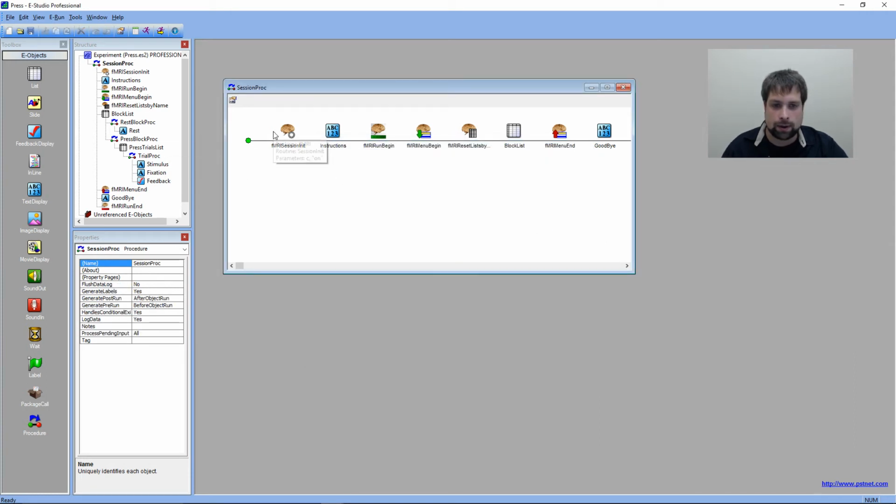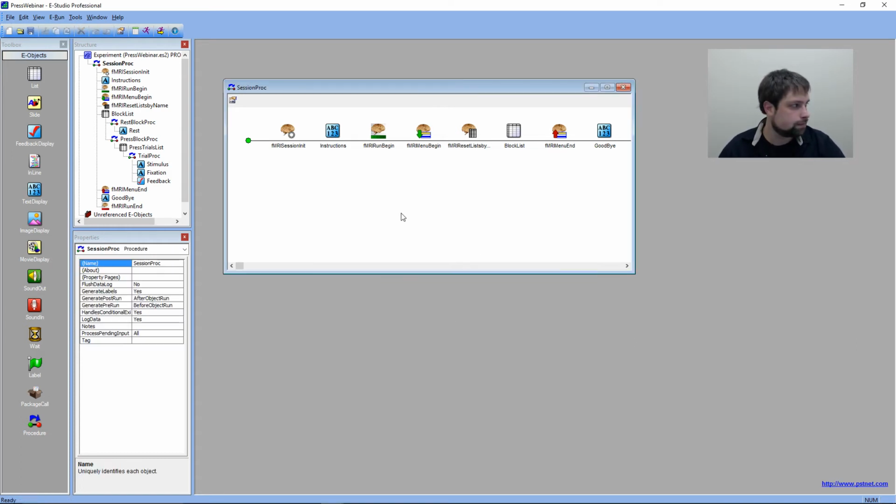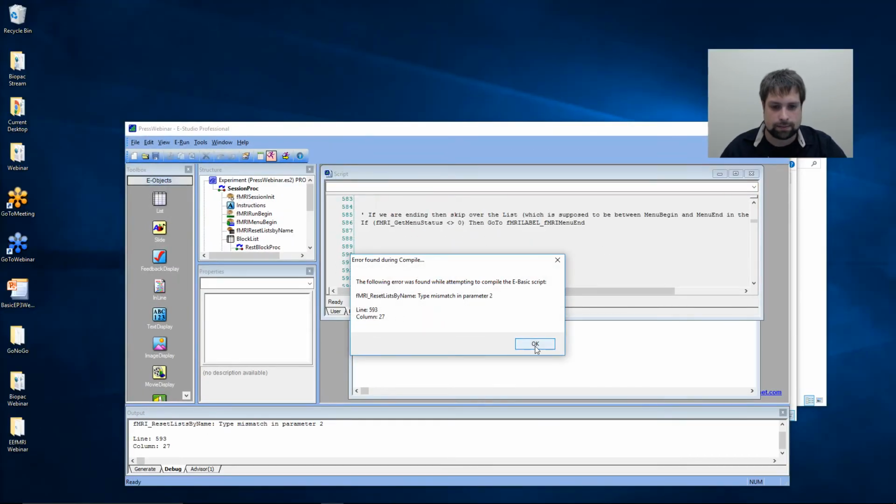So now what I've created is my session, my run. So this here is going to wait for a trigger or for me to press enter. And then now I have my menu already set up, and my menu is going to reset my block list every time it runs. So I'm going to go ahead and save this right now, because I want to run it to test it out so far, because right now it's sounding pretty cool. I'll just call it press webinar. And I'm going to go ahead and click run, and we'll see what happens.